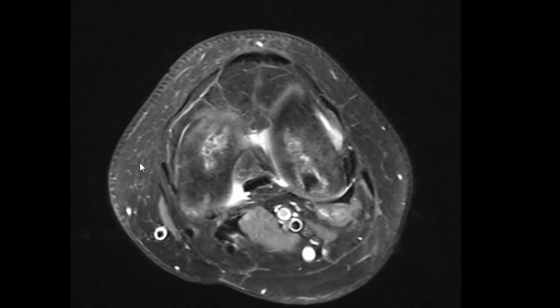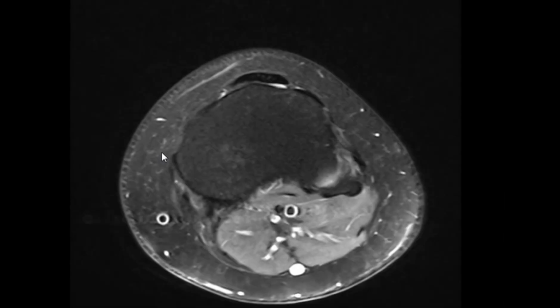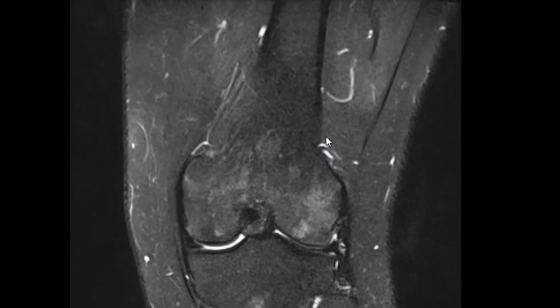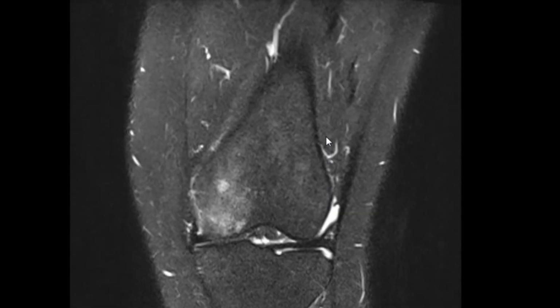There's multifocal high density signal in the bone in both femur and proximal tibia. Okay. Suggesting what? Suggesting bone contusion or... Anyone knows what's the name of this sign? Just move through the slides. Scroll. What is the name of this sign?